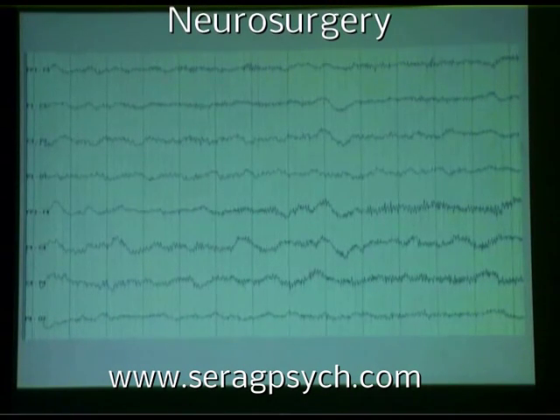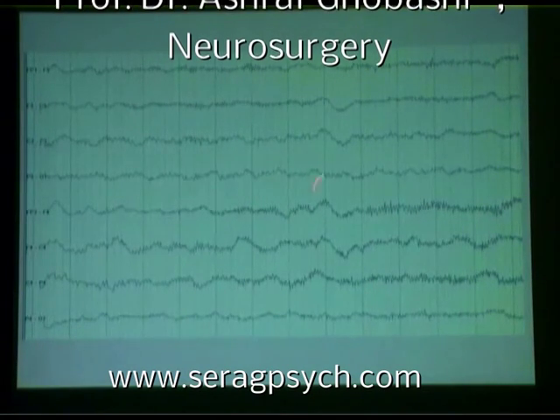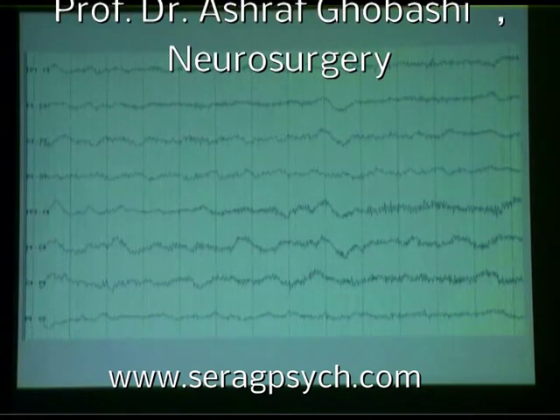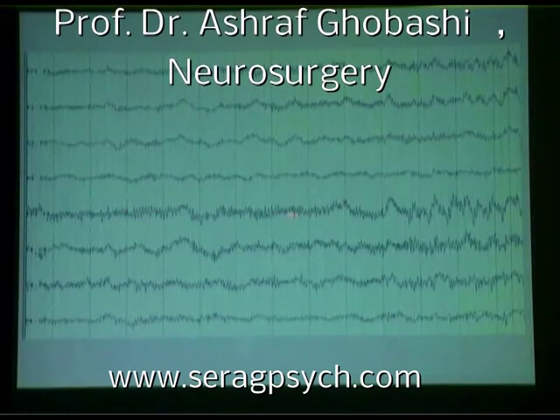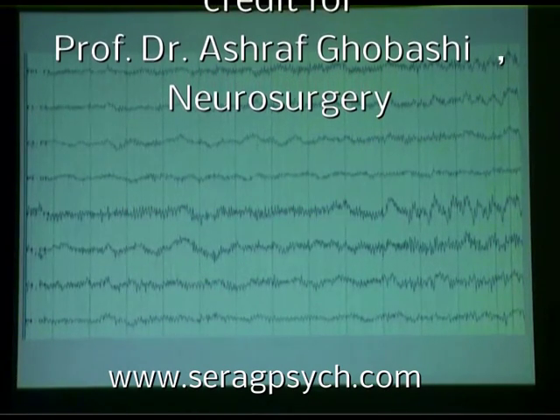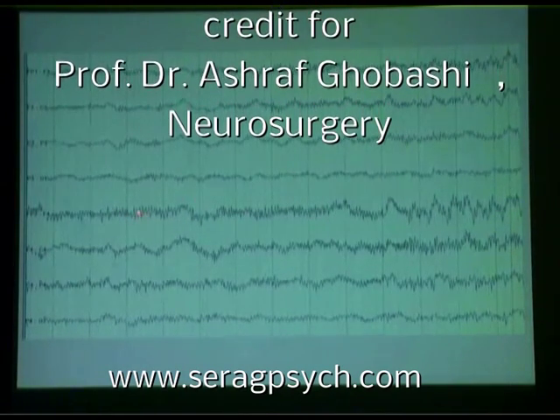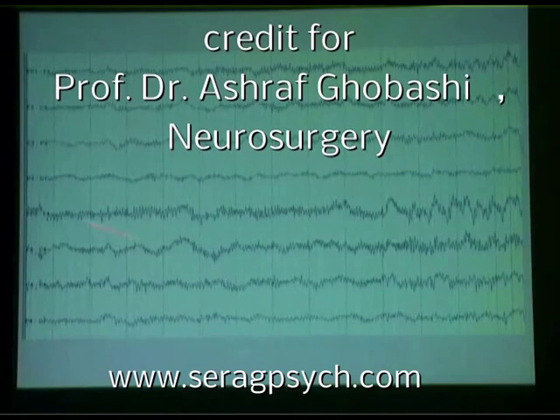Everybody see the difference then? Interictal, high frequency activity principally left, but ictally, you can see it here on the right. Next, please. And you can see this is continuing here, okay? And this is not muscle activity. If that were muscle activity, you wouldn't see these individual spikes quite so easily.